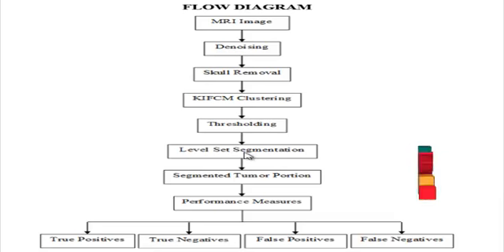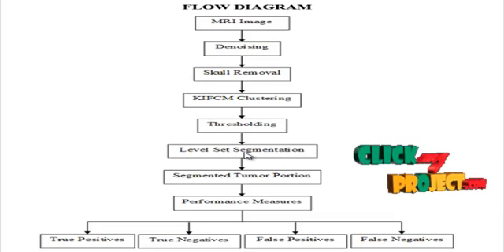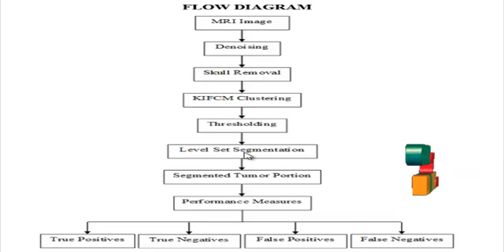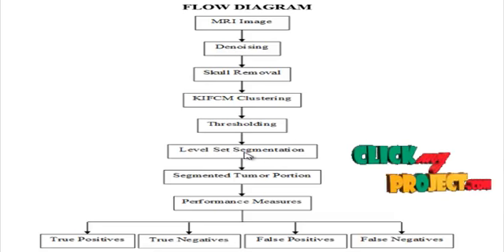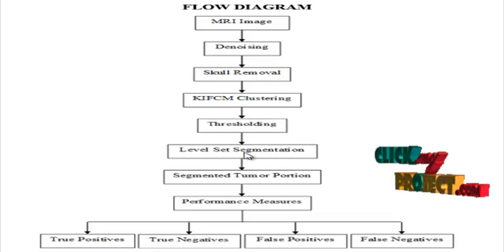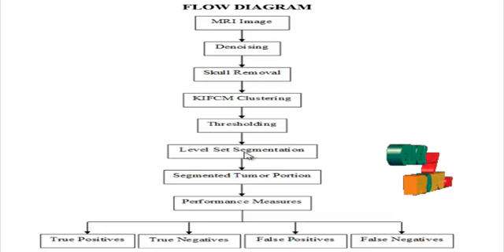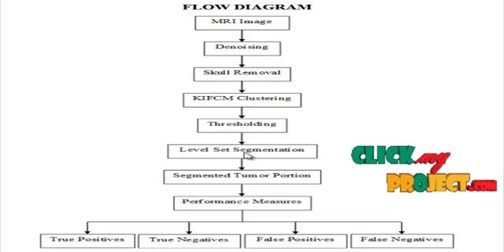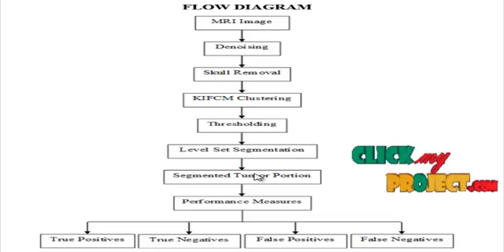The level set segmentation process is employed by reducing the segmented portion till the curve enclosing the region of interest is obtained. The tumor portion obtained from the thresholding process is considered as the initial portion of the segmentation process. The image pixels surrounding the tumor portion that have similar values nearby are grouped. Contours are extracted around the detected region. The process is repeated till the boundary of the detected region is within the input region. The final result obtained in the segmentation is the segmented tumor portion.